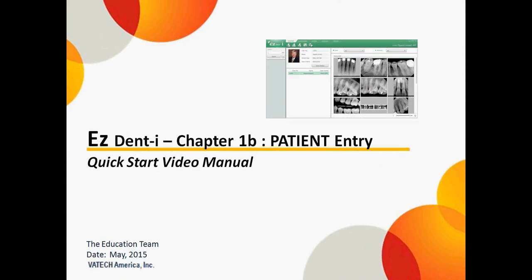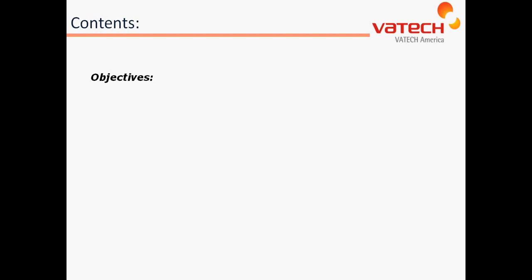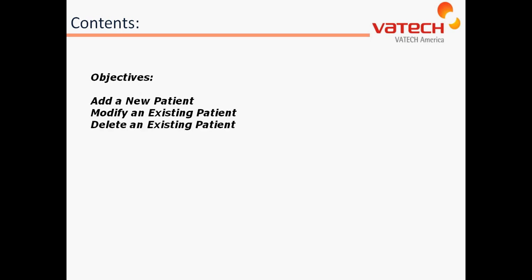Welcome back to the Vatek EZDent I Quick Start Video Manual, Chapter 1B, Patient Entry. The objectives will be to learn how to add a new patient, modify an existing patient, as well as delete an existing patient. Let's first begin by learning how to add a new patient.